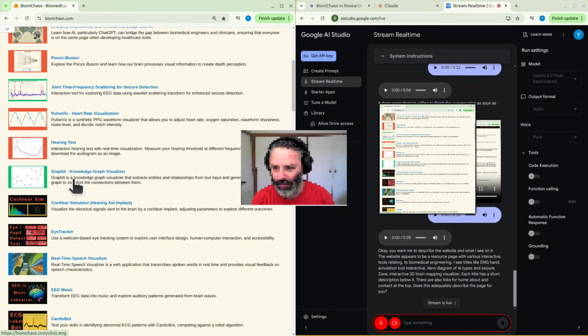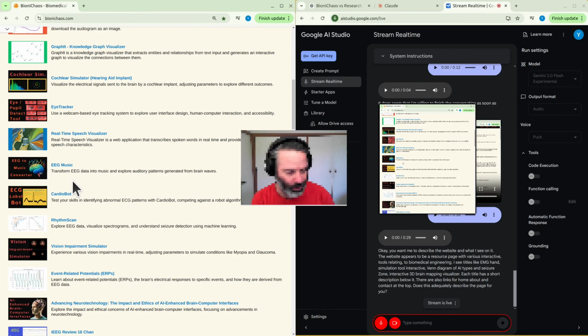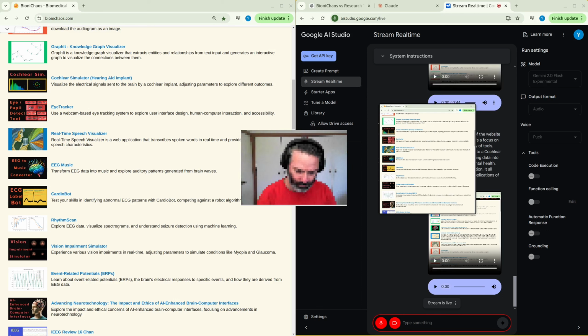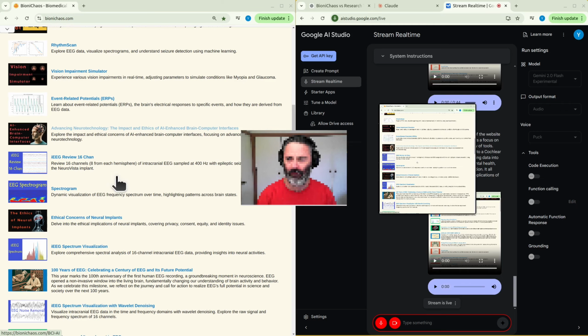Can you give a more general overview as well? I'm scrolling down the page. What else can you tell me about it? Okay, scrolling down the page, the overall theme of the website is tools for biomedical research and education. There's a focus on interactive simulations and visualizations, with a variety of tools ranging from EEG data analysis to eye tracking tools to a cochlear simulator. Many of the tools appear to involve converting data into visual or auditory formats. There are also tools for mental health, seizure detection, and even vision impairment simulation. It all seems to be related to neuroscience or biomedical applications of technology.